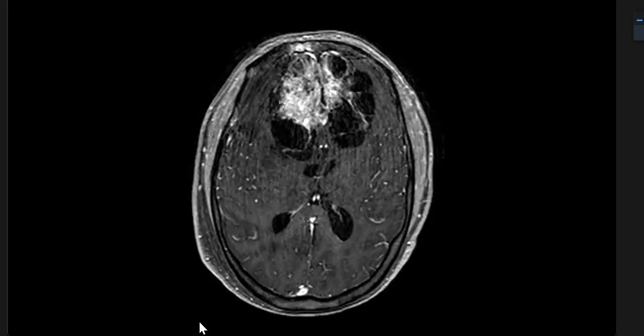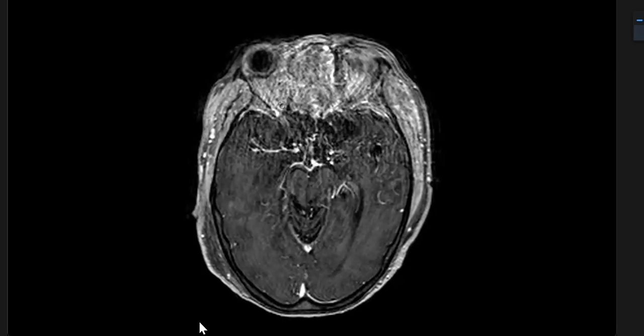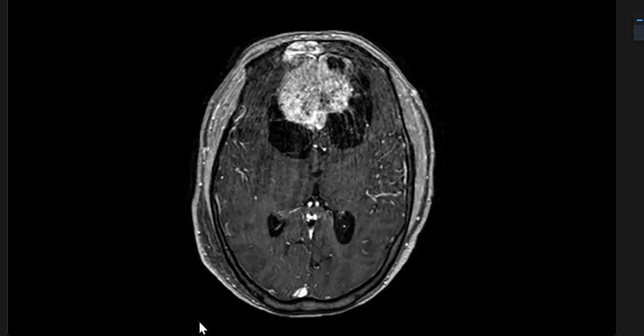In the MRI as well, MRI is not adding much to the diagnosis. I diagnosed this case straight away on CT scan, and MRI is a confirmatory test. MRI is confirming my initial suspicion of a process originating in the paranasal sinuses and the olfactory region and invading through the skull at the cribriform plate, involving both frontal regions.